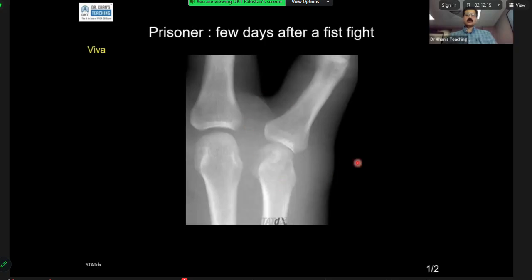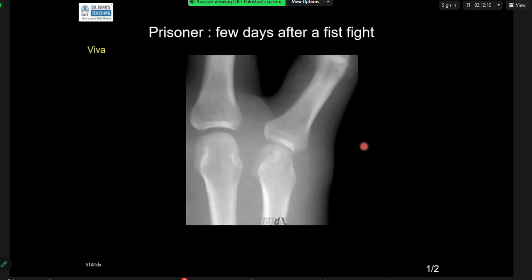What is your diagnosis? I am presented with a zoomed in radiograph of the metacarpophalangeal joint, I assume. There is a subtle lucency involving the metacarpal head. I'm not sure, I think it is the ulnar aspect, at the left side of the image, with surrounding subtle sclerosis.